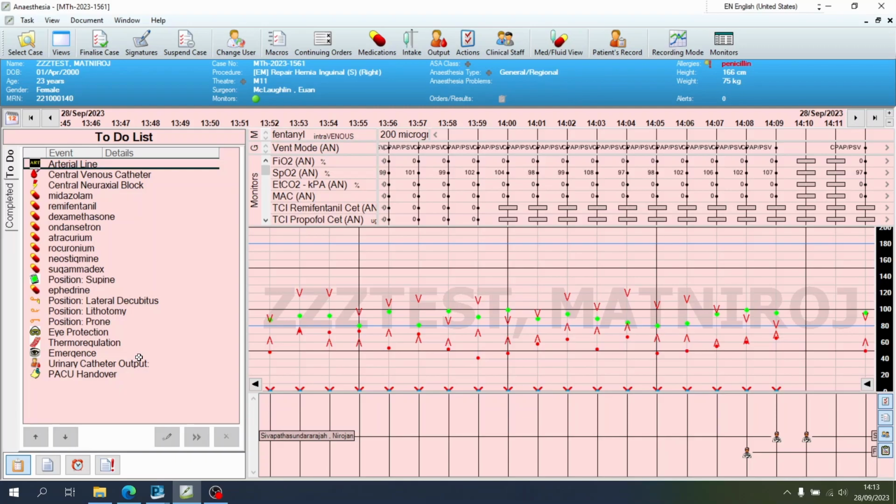As well as this, the complex mathematical models are not understood by the anesthetic solution. Therefore, we have adopted a way to document your anesthetic.